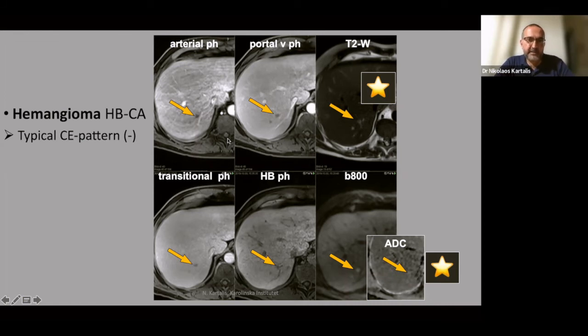You can just try to give it a second chance, look at diffusion, ADC map, T2, and of course the dynamics. And if you see that your lesion is becoming a bit smaller during the dynamics, still high signal on T2, and with non-impeded diffusion, the chances are quite good that the patient has hemangioma and not a metastasis. But it should not be the first contrast agent if your suspicion on CT is hemangioma. Probably it will make things a bit less easy for you.